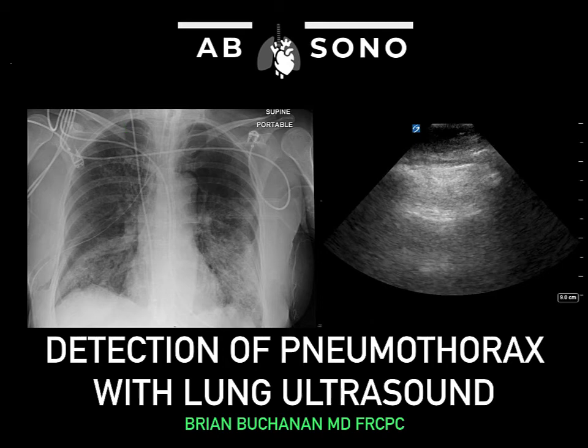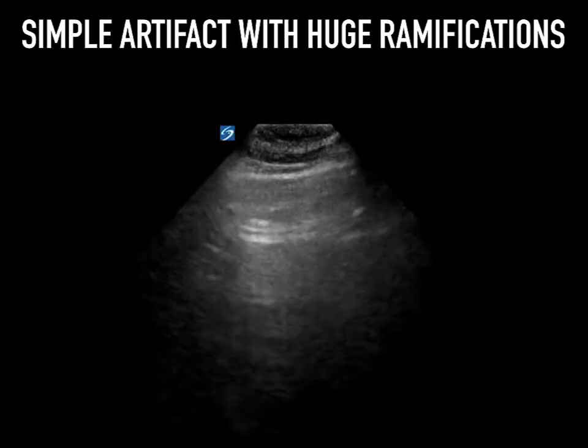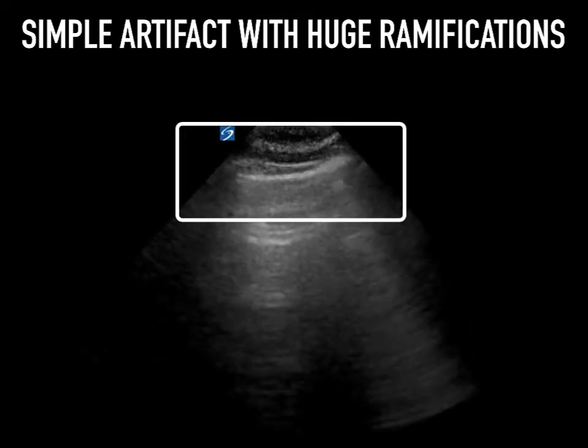We're going to cover detection of pneumothorax with lung ultrasound. A very exciting topic and one that I think you'll find clinically relevant. It really all starts with this very simple artifact with huge ramifications.